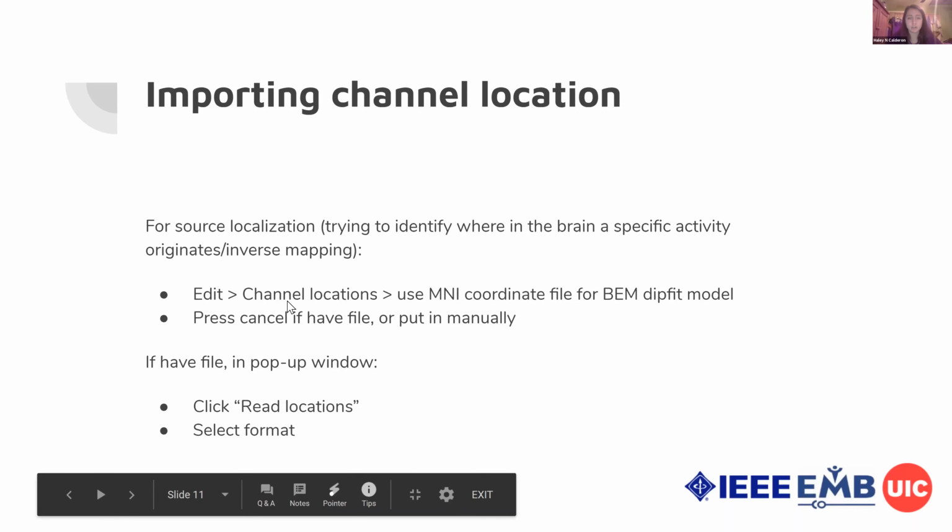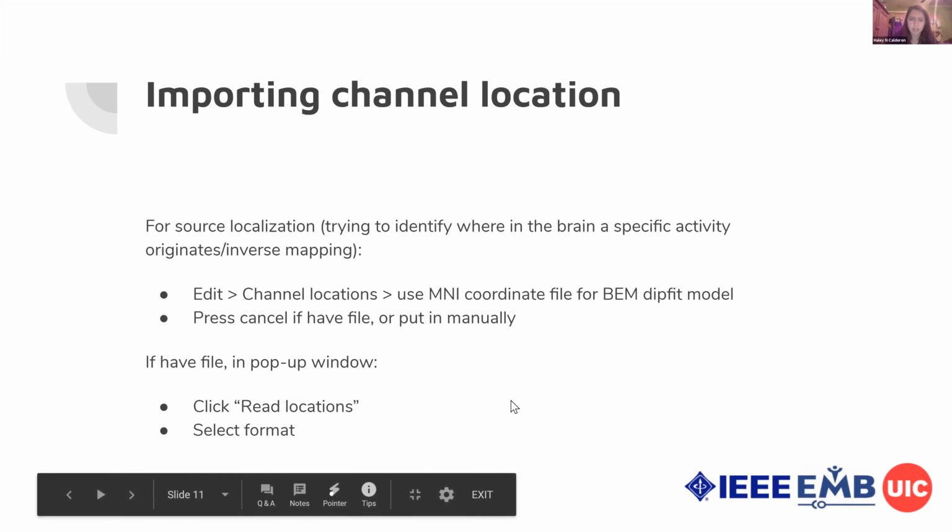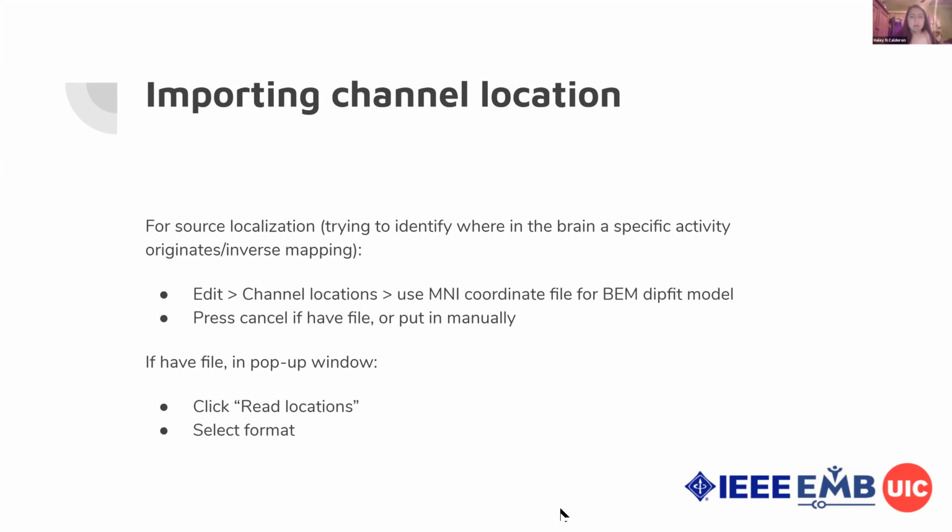So you edit channel locations, use MNI coordinate file for BEM dipfit model. That being said, I think on the most recent version of EEGLAB, you don't have to do that. I believe it is already using MNI coordinates. I forget how many times I played around with it, so I don't know if it saved mine, but I believe it is just straight MNI coordinates.